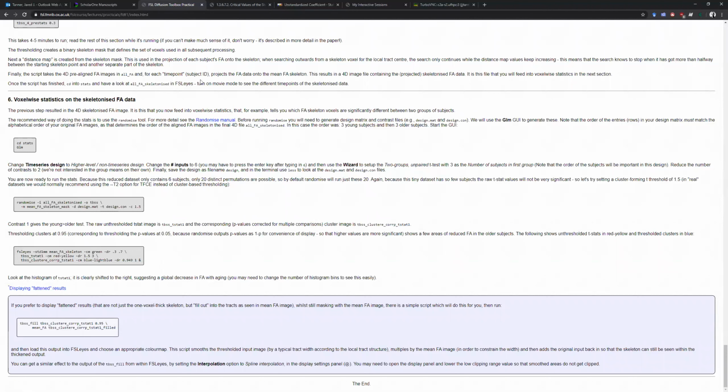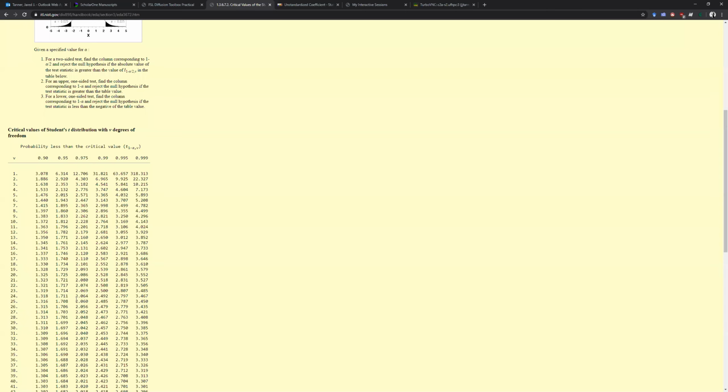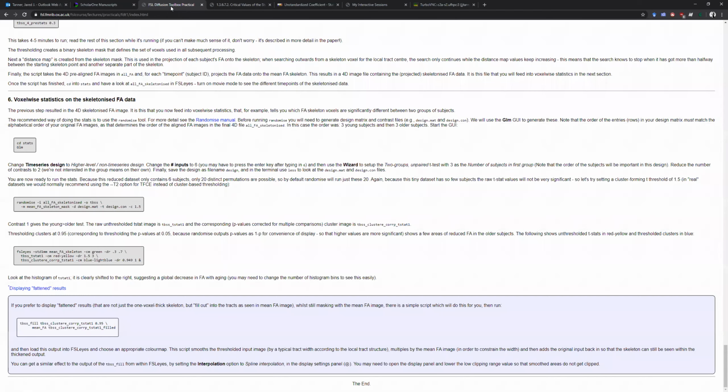And so that 1.5, this will go back to our critical values. So really, we don't want a critical value at 1.5. If we want to be a little, we could stick with 1.5. Again, that's about right here, p of 0.9. We want to be a little bit more robust. So we could increase it up to 1.771. And 3 we can keep.